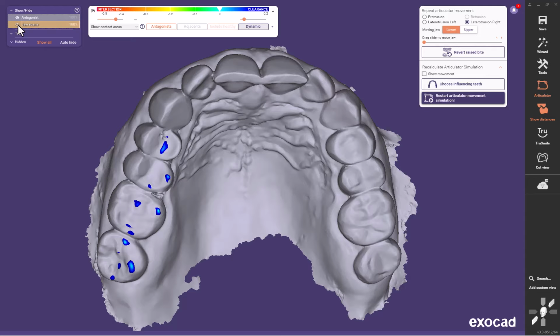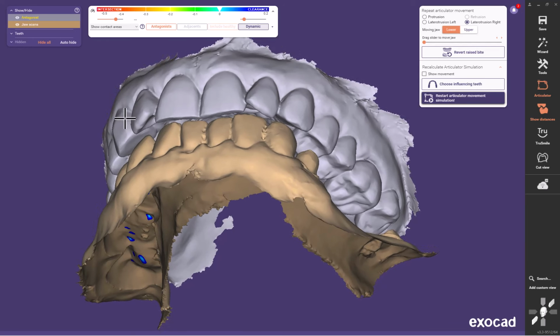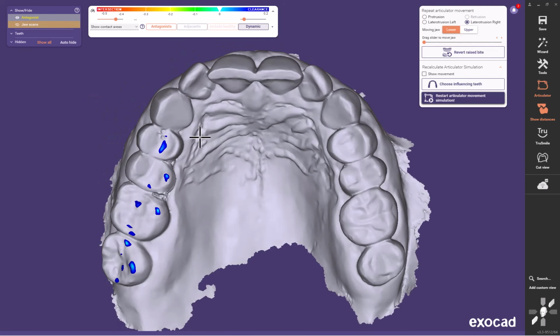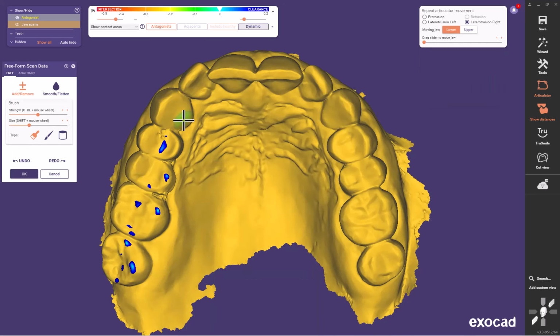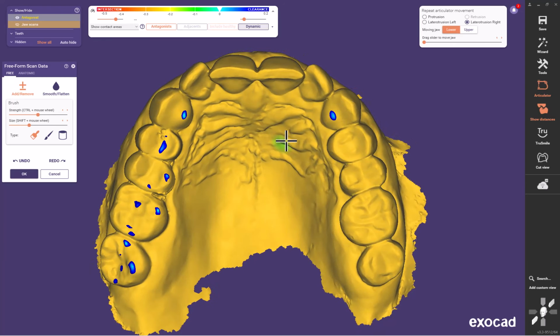Let's look at our cuspid. Looks like it's separated pretty far, but I was pretty amazed when I did the modification at how it turns out. So we're going to continue modifying this molar, and now this time I'm just going to add a cingulum until I get contact. Let's add a cingulum over here till I get contact.